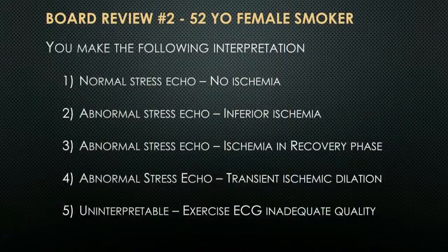So you make the following interpretation. Normal stress echo, no ischemia. Abnormal stress echo with inducible inferior ischemia. Abnormal stress echo with ischemia during the recovery phase. Abnormal stress echo with transient ischemic dilatation. Uninterpretable because the EKG was inadequate. I think we can reveal the results.